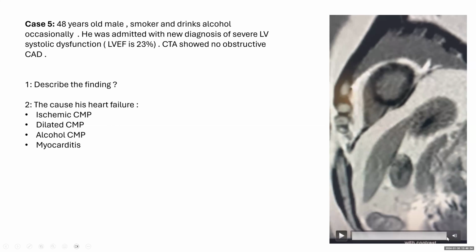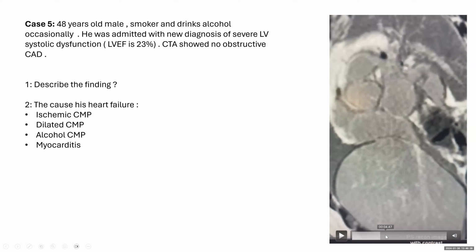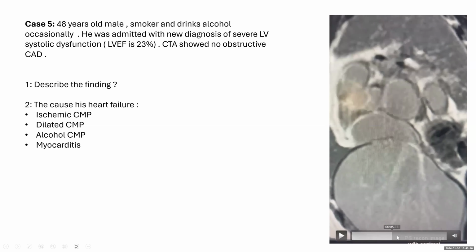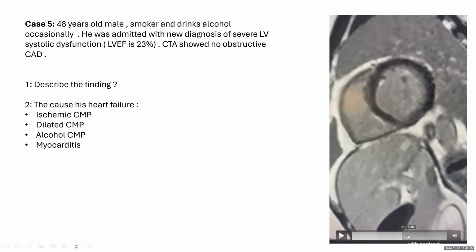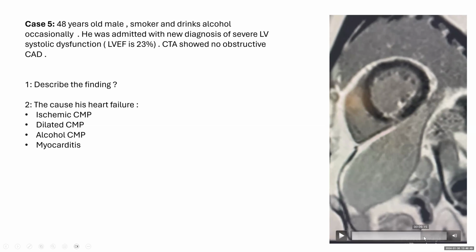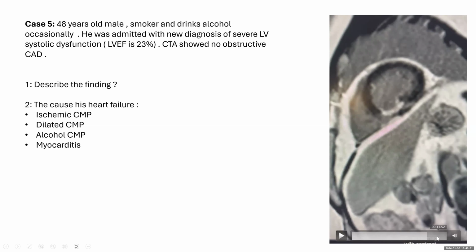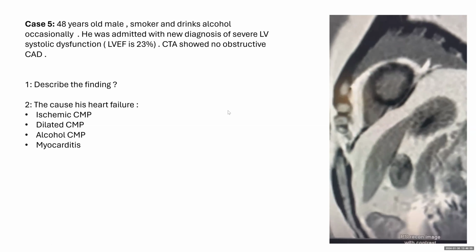Okay, can you repeat it? I will repeat it. So from here, we're going down the left ventricle. Mid, mid to distal, distal, apex.